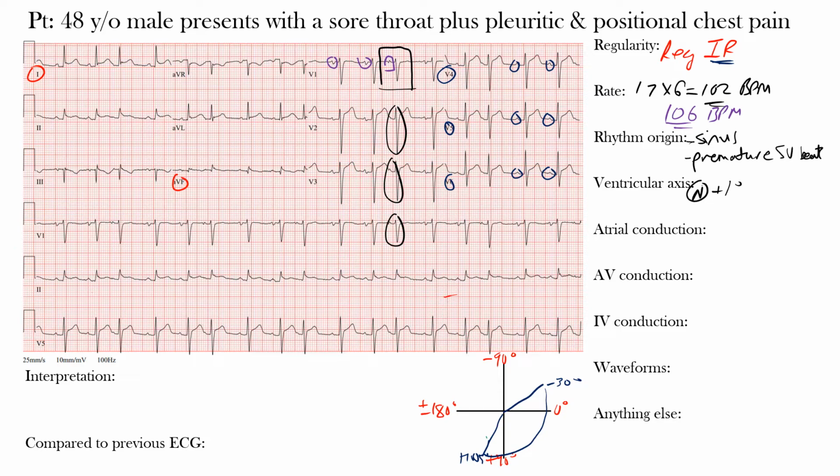And then we have a left axis deviation, which would be in this region here. And this is more pathological. This is what you sometimes hear as the physiologic leftward shift in this region here, but still considered normal in most adults. And then we have this extreme axis deviation here, and then this is the rightward axis shift, right axis deviation. Okay, so we're going to look at lead 1 as well as lead AVF.